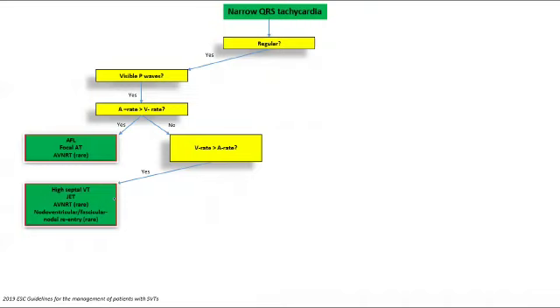You might be dealing with a high septal VT, because it's coming from high up top and then conducts downwards, so it presents with a relatively narrow QRS complex. Or you might be dealing with a junctional ectopic tachycardia, or rarely an AVNRT, or even nodoventricular or fascicular nodal reentrant tachyarrhythmias.